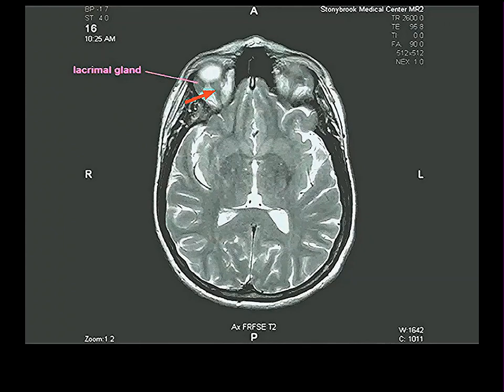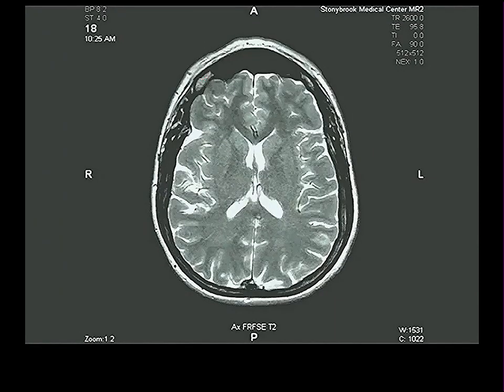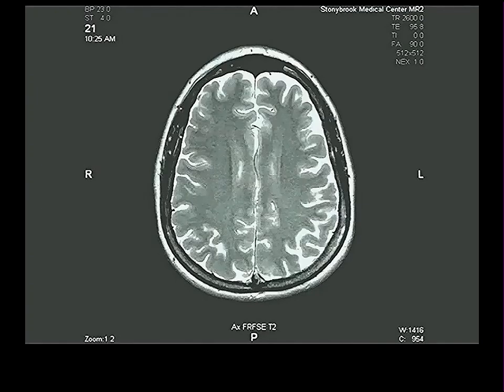Why do I say that? Levator palpebrae superioris has a very narrow origin and then spreads out like a fan. Superior rectus has a wide origin and stays there. So if I thought this had a narrow origin, I'd call it levator palpebrae superioris. Coming up a level, nothing new of excitement. Coming up. Up, up, up.